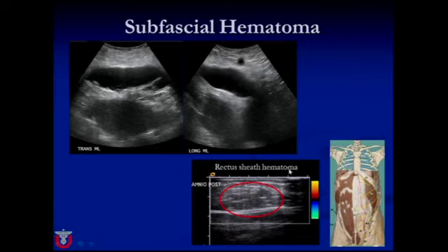One thing that we don't always think about in the pregnant population is the location of the inferior epigastric artery. All of you that do paracenteses know that we're very careful in the population with liver disease or who have cancer and have recurrent ascites as a result of that, that when we do therapeutic paracentesis, we check to make sure that we don't puncture an abdominal wall vessel. This is a person who had a lung maturity amniocentesis, and this is a rectus sheath hematoma. And we didn't really need ultrasound because the patient was acutely symptomatic as soon as the needle was withdrawn. But if there are any questions, get out the linear transducer and focus on the anterior abdominal wall if you don't see anything with your deeper search.